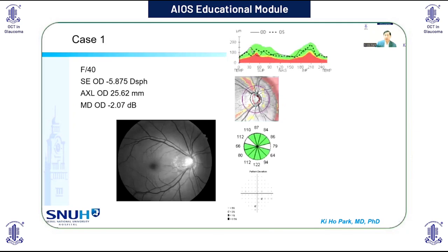And in the thickness curve, you can see the peak was temporally shifted, both superior temporal and inferior temporal part. And we can see the red disease in this superior area, because the superior peak was temporally moved. And the true defect was in the inferior temporal area here.